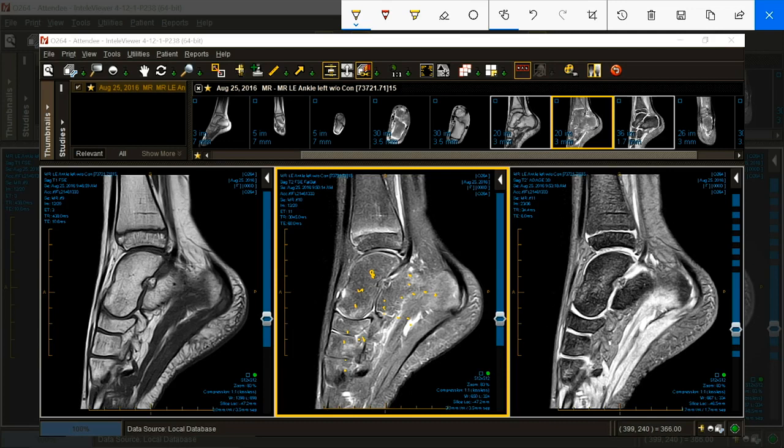And you are seeing accelerated bone turnover with transient osteoclastosis and hyperemia. This is a known physiologic event of what we call the lower extremity juvenile foot abuser. Sometimes they have pain, sometimes not. The treatment is to try and slow them down a little bit. It's not worrisome.